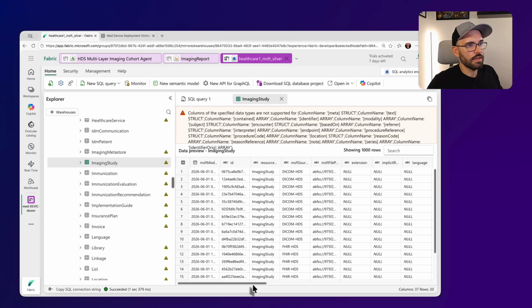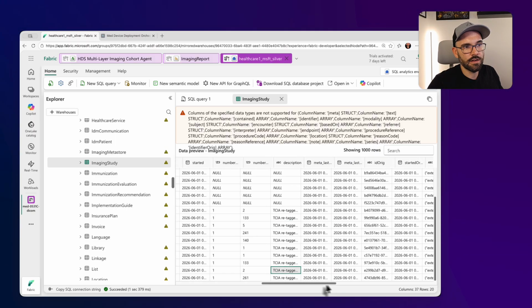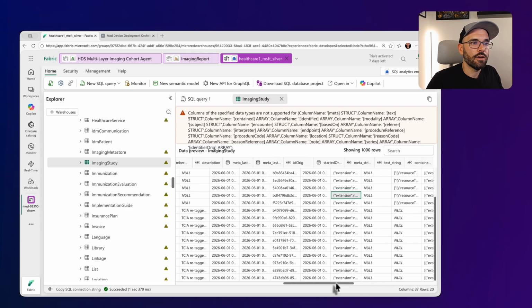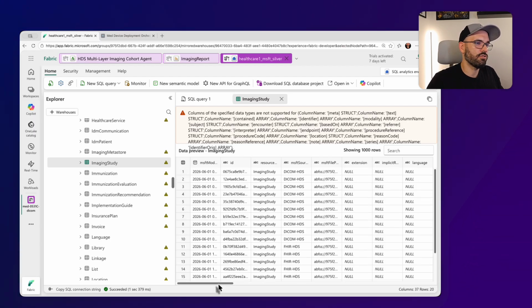And if you notice, I'm getting them from two sources. I may have had some more information about where it's coming from. Here I'm actually putting in some metadata about where the data is coming from. I got some more information about the source system and what it sent me. This is all wonderful and great for me to look at and see. And this error up here just tells me that as I was importing data, I needed to cast type something, but it's not actually an actual error.